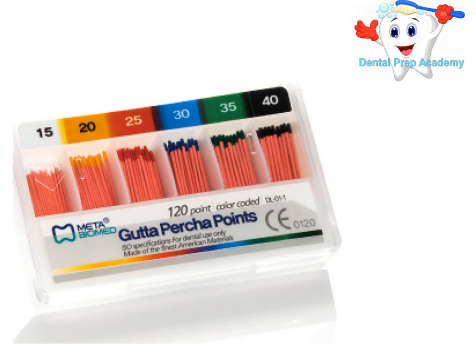Now this is the image of gutta-percha, ISO standardized gutta-percha. I am saying that this is ISO standardized because it has got color coding. As you can see the colors on the gutta-percha: white, yellow, red, blue, green and black respectively.